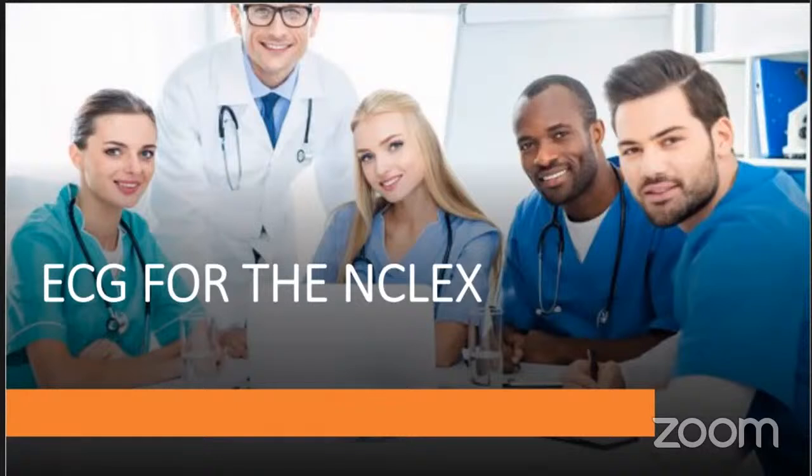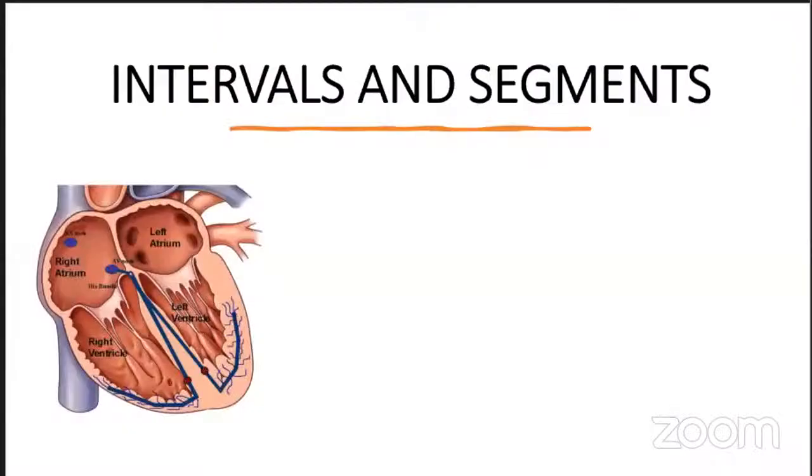Okay, so we're going to start with basic physiology and just remind ourselves of the waves, intervals, and segments you will normally have on the ECG.